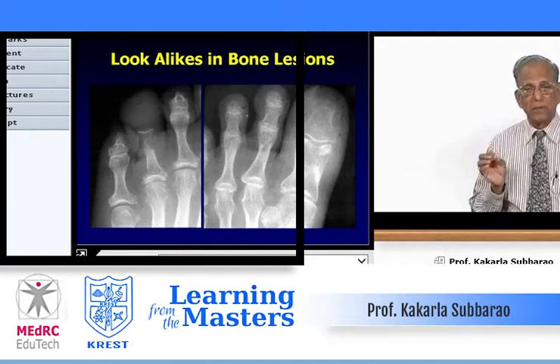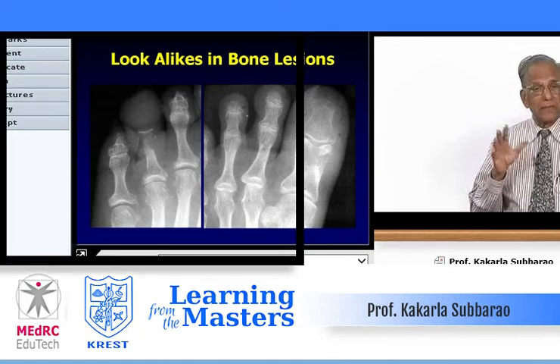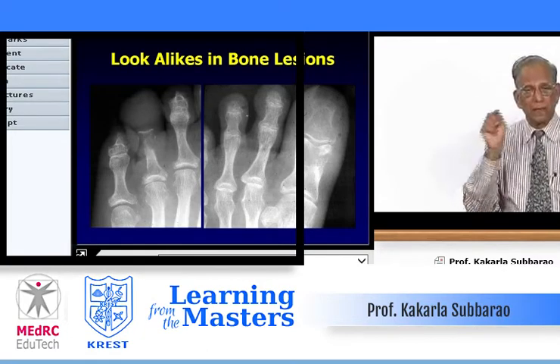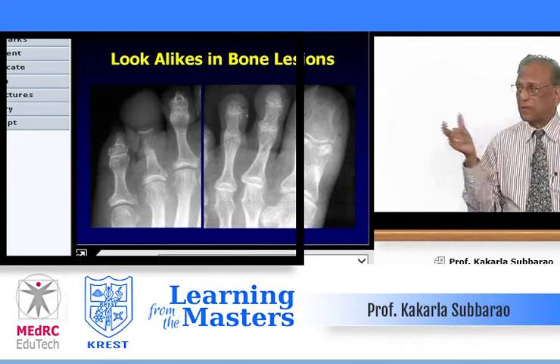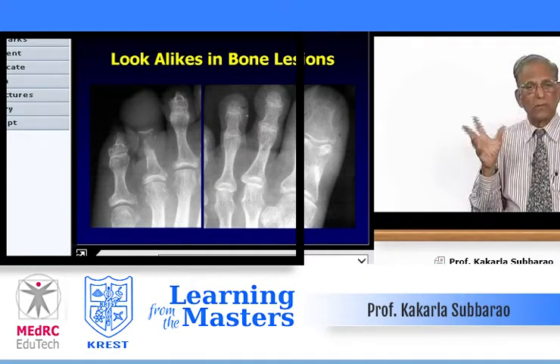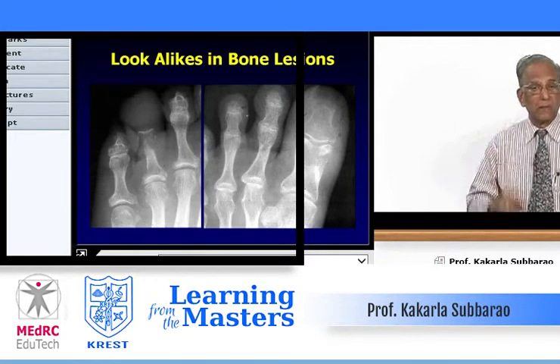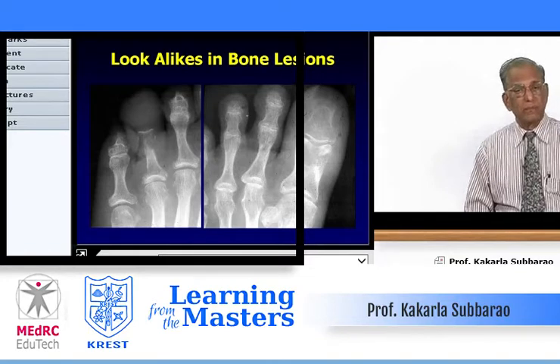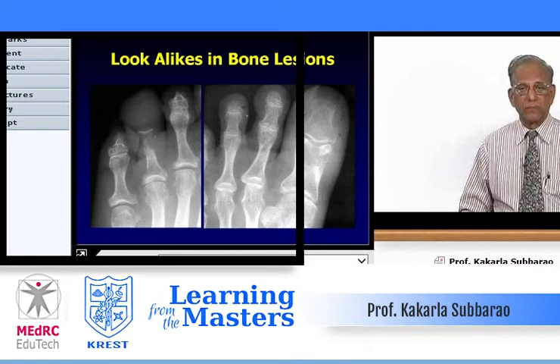But you see, one thing I have to make clear, periosteal reaction appears easily and grossly in long tubular bones, not in the short tubular bones like the carpus or even tarsus. Same thing in phalanges also. There are more or less cuboidal type of bones. So immediately you don't get periosteal reaction. Not that periosteal reaction does not occur, it does occur. It takes time. And we said it is tuberculosis.